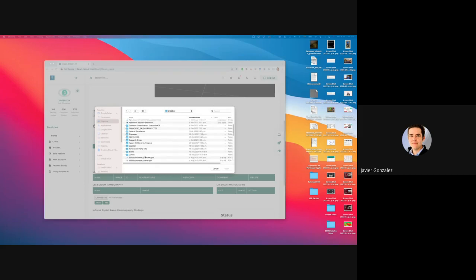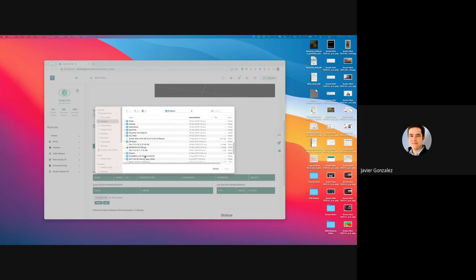Okay, here. Let me see where the files are. Here they are. So let's grab this one.